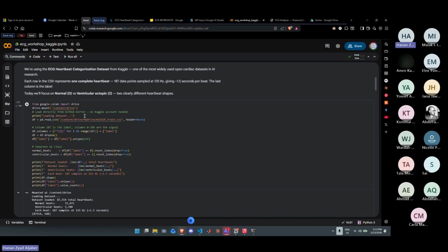Okay, great. So what happens here is we will load the data. This is where we bring in the data set. It's just 2 lines of pandas where we mount the file from Google Drive. It will connect your Google Drive to the Colab environment, and you will have to authenticate that. Basically, it's going to give it access to your drive. The CSV file, as I said, is too big, so that's why we have to do this. We will read it using pandas, as you can see here.